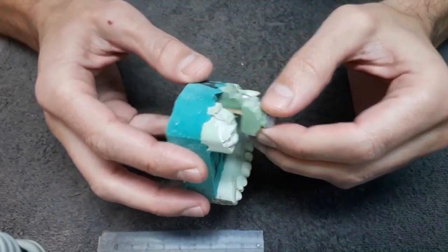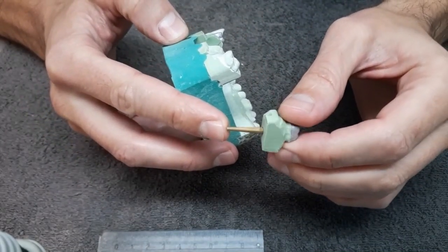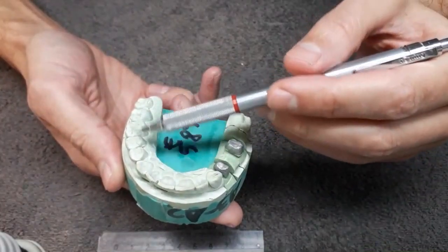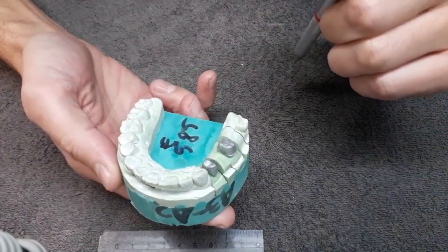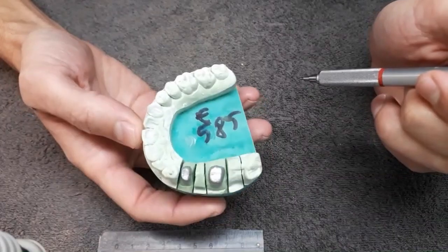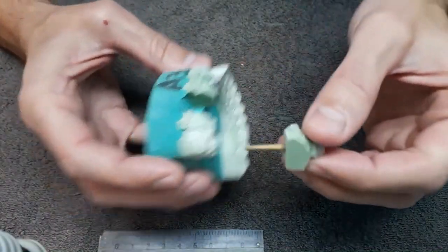Here we have a pin. It's a simple pin, has nothing around it, just a pin in the plaster. That is the arch. The arch is regularly class 4 plaster. The abutments have been cut, separated, and the margin of the preparation has been made evident. This is the pin.